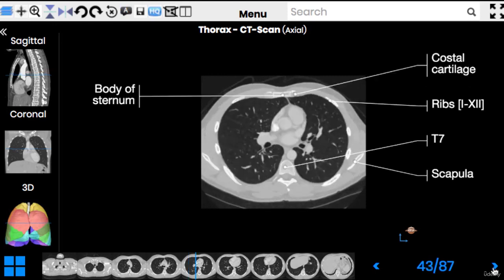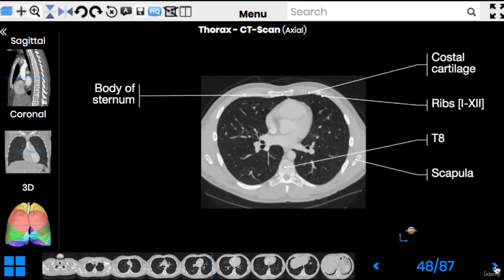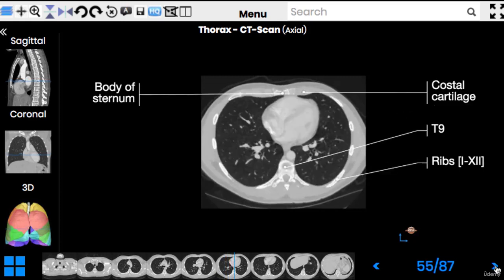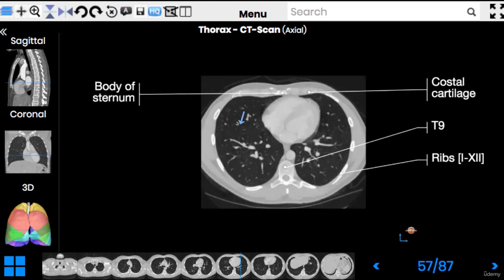What are the other tiny dots and lines which we have in the field of the lung? These dots, they are vessels, the pulmonary arteries and veins. Is it possible to figure out what is one or another? Yes, it is. The arteries usually follow the bronchi. So if you see the bronchus close to the vessel, this vessel is the artery. And the vessel which is independent in the tissue of the lung, somewhere here or there, these are the pulmonary veins.